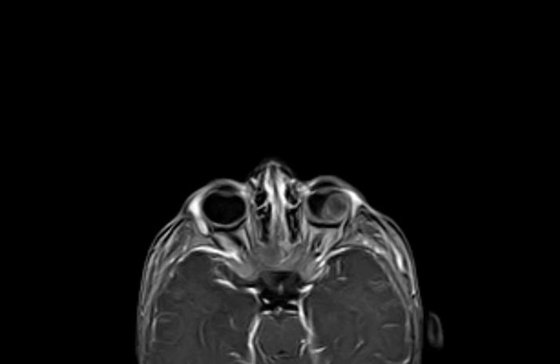Won't you do an ultrasound to see if this mass is vascular or not? Make a little Doppler study, especially that he is sedated already. You just take him to the ultrasound, put the probe, take it up and down, see if there is any vascularity within the mass. Is it bleeding, for example? It could be some sort of retinal hemorrhage. For example, I'm just saying. You can.